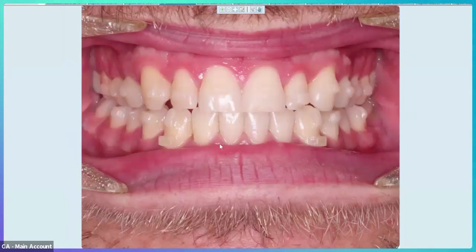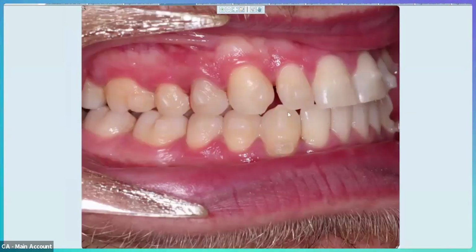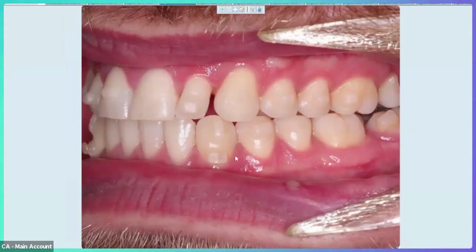We're now at the point, though, where our overjet is actually better. We're no longer biting in a significantly tight overjet. And so the patient at this point is actually set up pretty nicely to move ahead with doing his restorative.